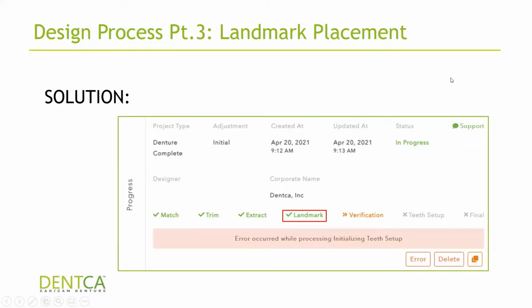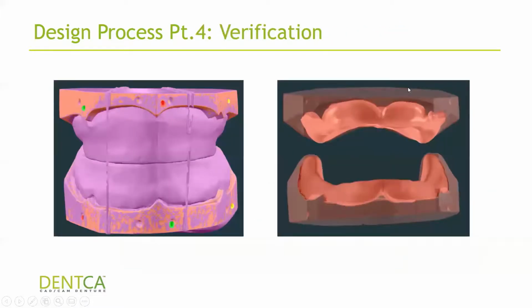That's a small workaround. The software gets confused because it already had a pre-saved version of the matching, and then you went back and created a second one, so it doesn't know which one to read, and that's basically part of the reason why it goes a little bit crazy.